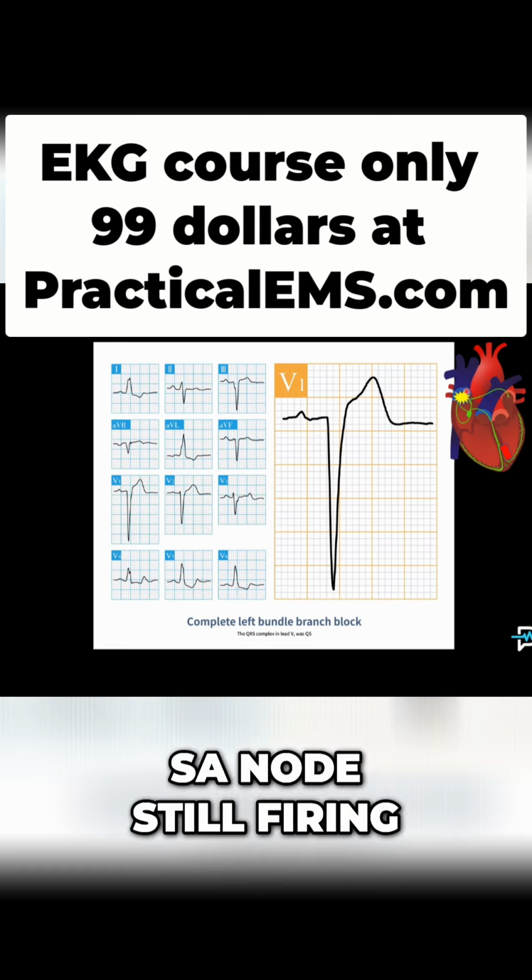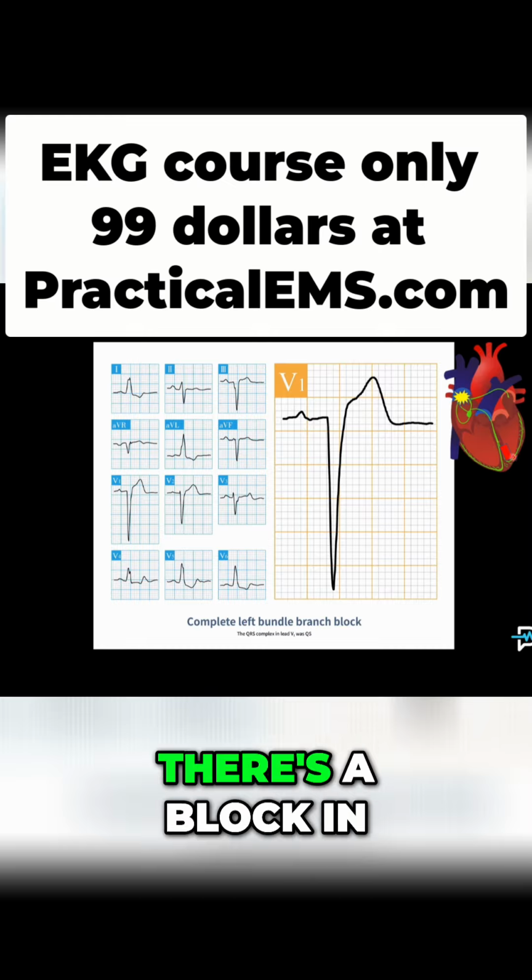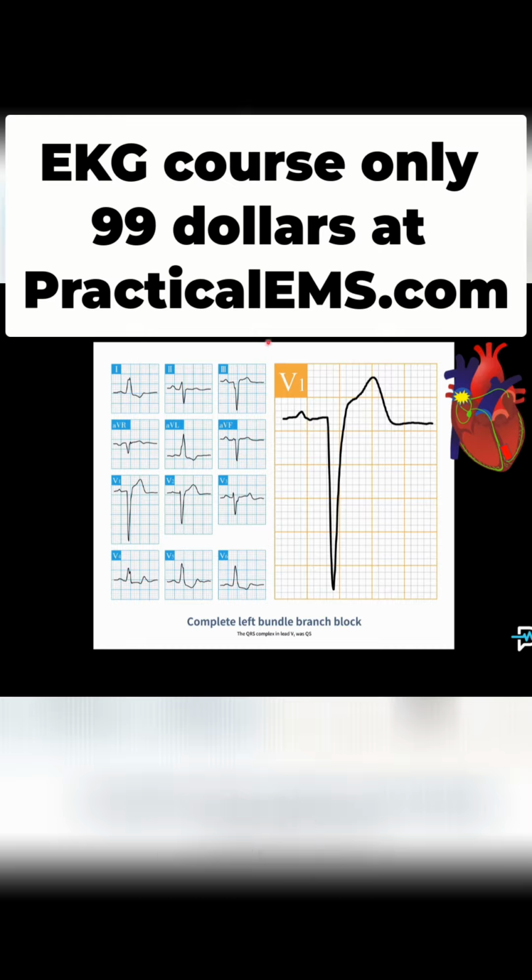And again, SA node still firing, but when you get down to the left bundle, there's a block in there somewhere, and that's what causes this.